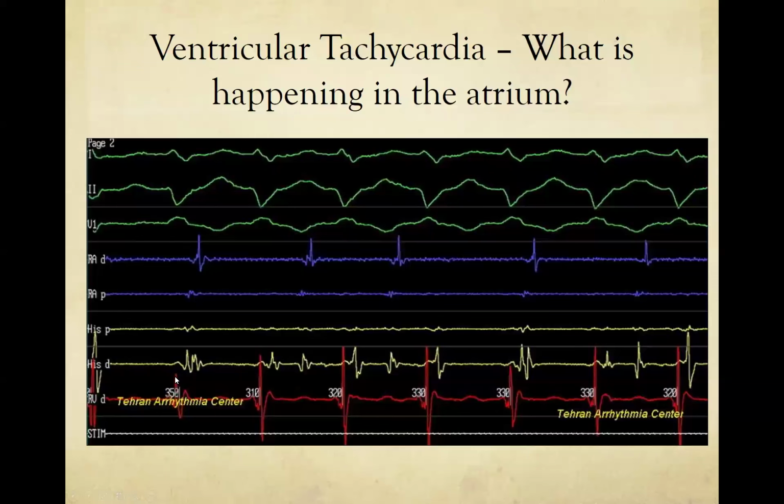We can see that the interval between this ventricular electrogram and the onset of the atrial electrogram has gotten quite a bit longer. Here again, this VA interval seems to be even longer. We don't have calipers, but just to your eye, you can tell that this interval from here to here is shorter than the interval from here to here. Then here we have a V and no A at all. The pattern starts all over again, just as it can antegrade. Here's VA with a longer interval, and then a V where we don't see the A, but presumably the interval is even longer.